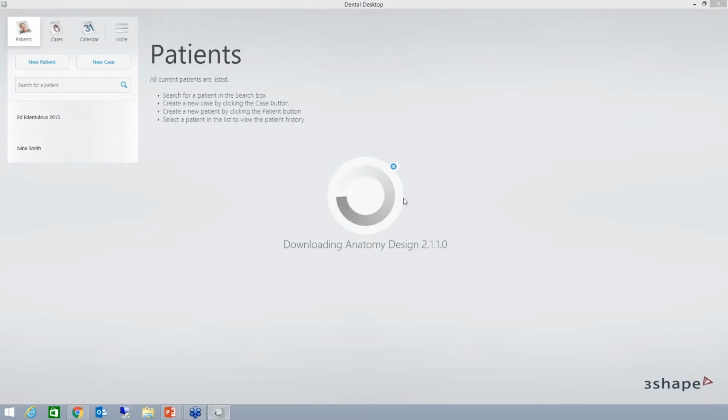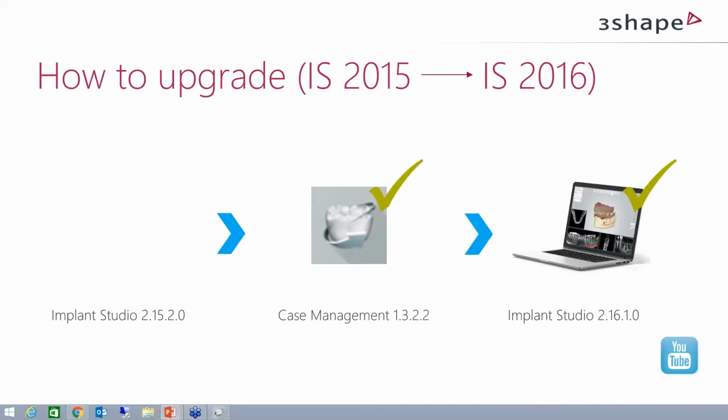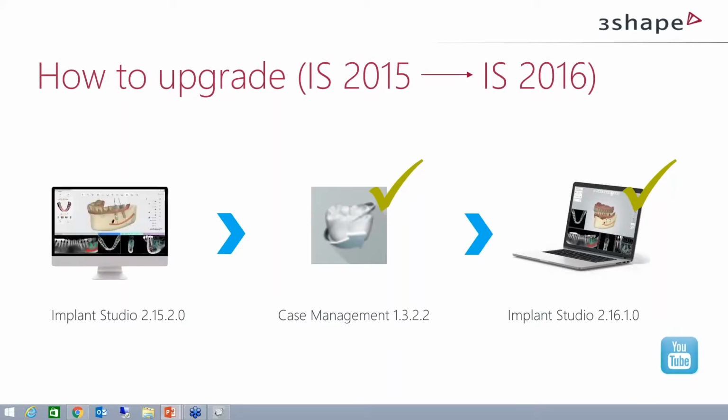All right, maybe while it's being downloaded and installed, you can see that all my cases are still here in the system, so nothing has been changed, and all my libraries are still there. I will get back to it in a couple of minutes. So as not to waste our time, I can continue with the presentation.